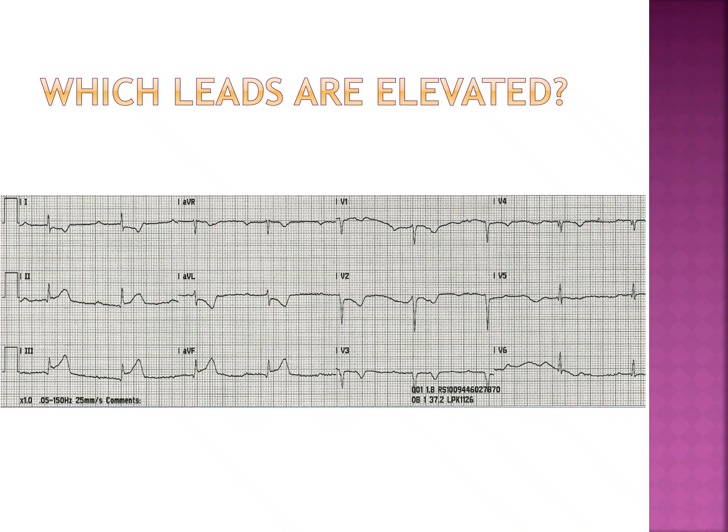And now let's look at 2, 3 and aVF. Man, we've got ST elevation in 2, 3 and aVF.